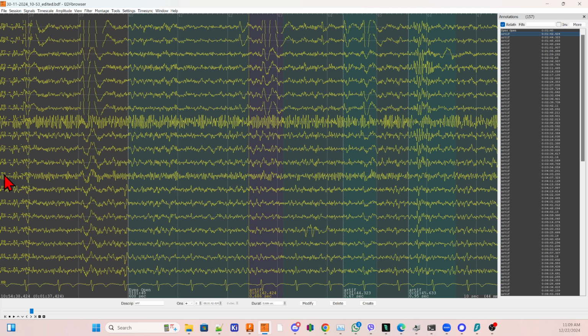So I record them, but I don't actually use them. I'm not going to make annotations on this one channel because it's so noisy. I'll just kind of look past it. But here we have an eye blink, and you can see I have annotated that eye blink with an Artif. I call it Artif.